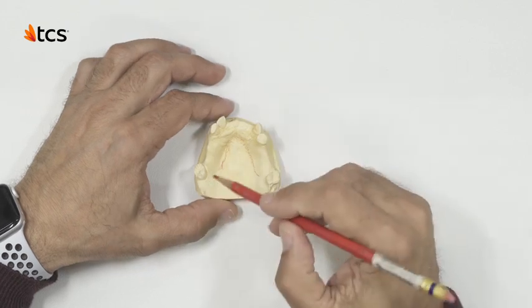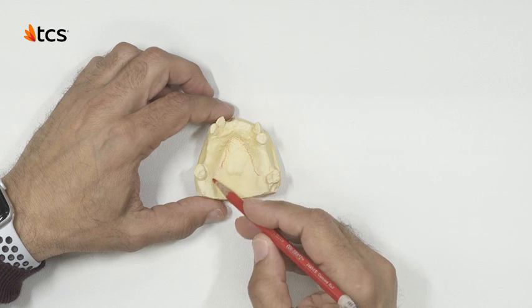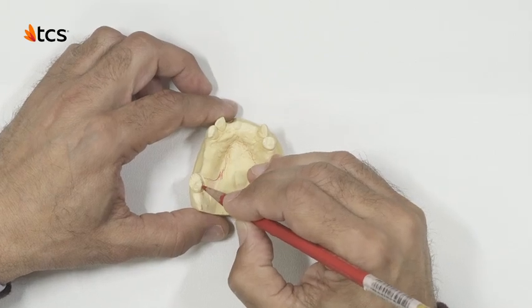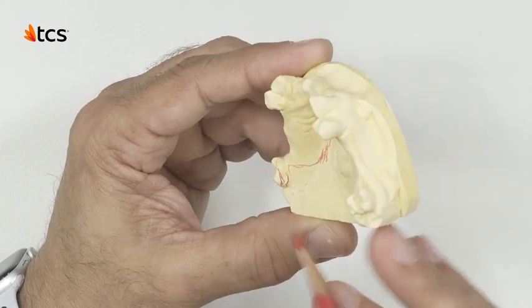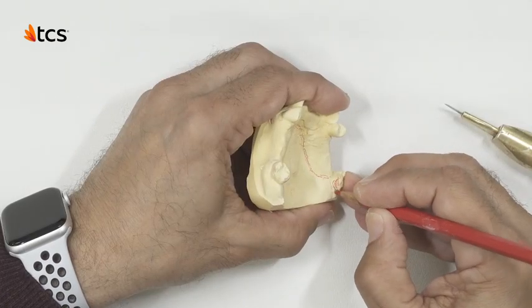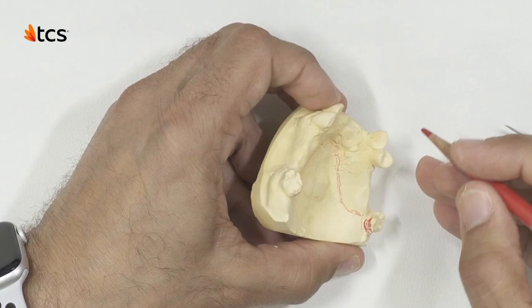As for the lingual design, we have two options. One is to plate it using surrounding tissue. The second option is to use a finger clasp design. This option will use less material and will be more comfortable for the patient, especially under mastication. We will utilize the same finger clasp design on the buccal side of the molar. Since it is not an area of aesthetic concern, bringing a finger clasp to the height of contour is advised.